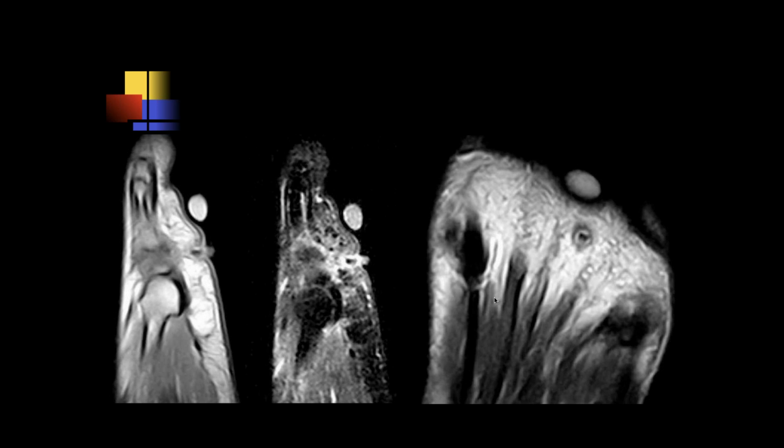What I wanted to say, John, is if you look at these foreign bodies, the thorns, they're usually horizontal. People don't step on these; they kick them. They kick the palm frond out of the way, and a thorn sticks into their foot. Interesting. Now that we can see them on MRI, it's not that difficult to locate.